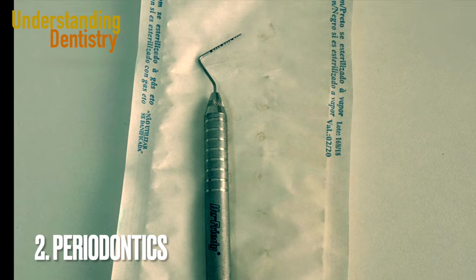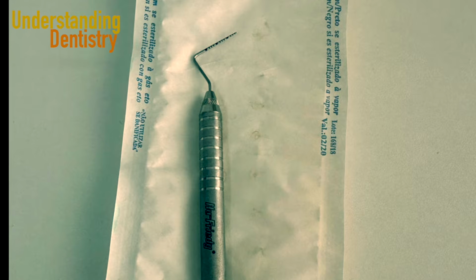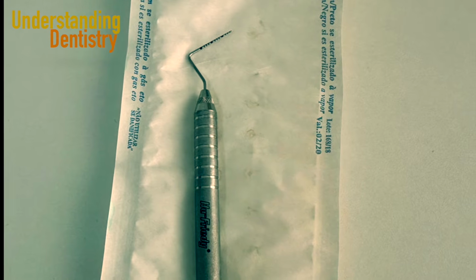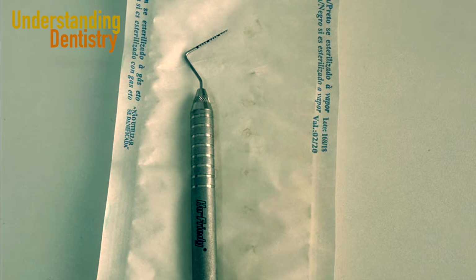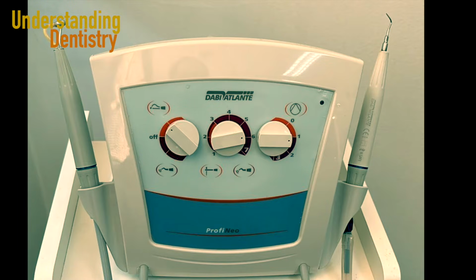Alright, let's see now a little bit of perio, and then we have the probe, of course, the periodontal probe. You are going to use this in your clinical examinations a lot, and it's very important. So you have the millimeters, you have the measurements, and then you should be careful to use this on your periodontal assessment of the patient. Then we have the periodontal curettes, and they have different shapes, of course, because they are very good for different teeth and regions.